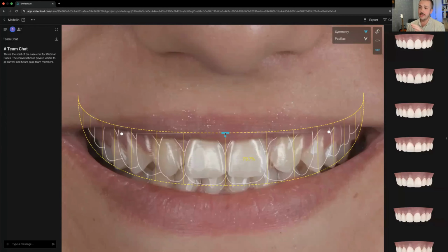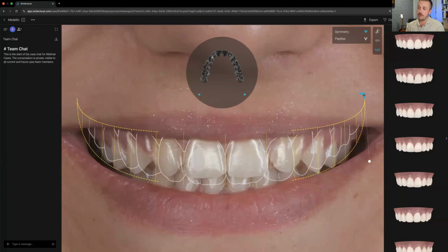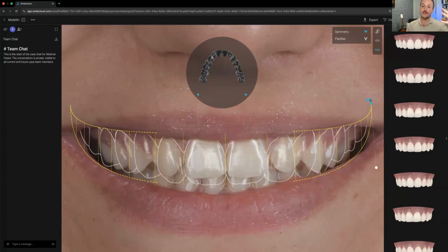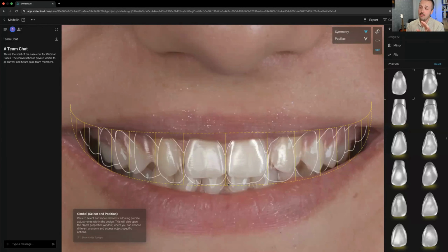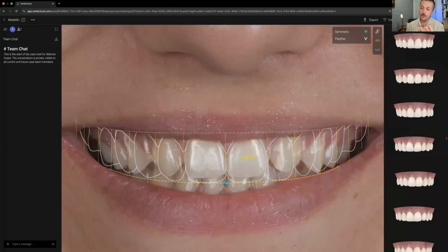And when I'm doing smile design, when you're doing just 2D, you don't have many options. You don't see the length of the teeth. You don't have a lot of information about 3D positioning of the teeth, but you can already do a lot of corrections. For example, you can choose to widen the buccal corridors, position the teeth one by one. So you can click on the tooth and move it singularly. And you also have the ability to adapt this grid to whichever type you want.